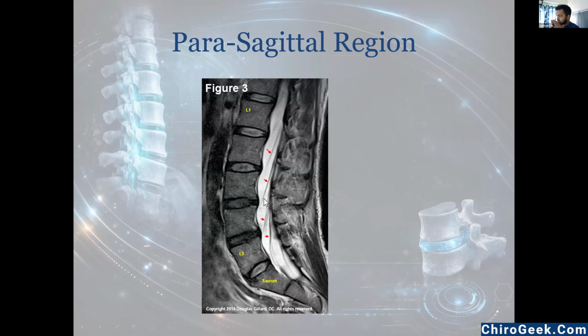So this is between the true sagittal view and the foramen. Here we can see the traversing nerve root also, but this nerve root has not come out yet. Usually the nerve root goes from posterior to anterior and inferior, and then comes out. So this is the in-between cut before it exits. This is the parasagittal view.